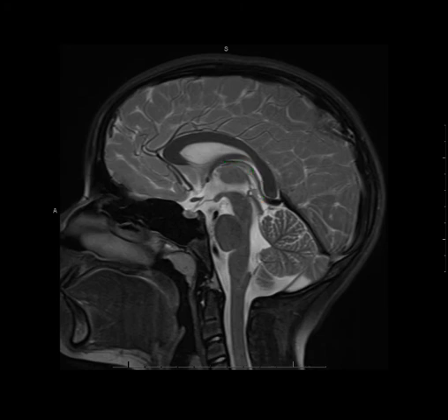On the arterial side we see branches of the anterior cerebral artery, specifically the A2 branches just beyond the anterior communicating artery. When it swings back posterior over the corpus callosum, that is referred to as the A3 branches, the main branch of which is the pericallosal artery. Most people have a callosal marginal artery that runs a little bit higher in the cingulate sulcus, but this patient doesn't have one.